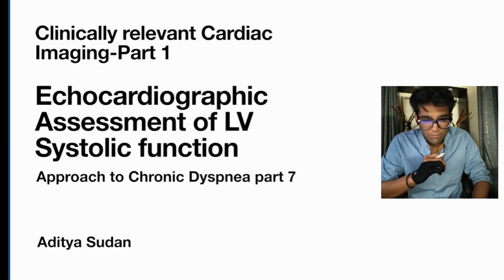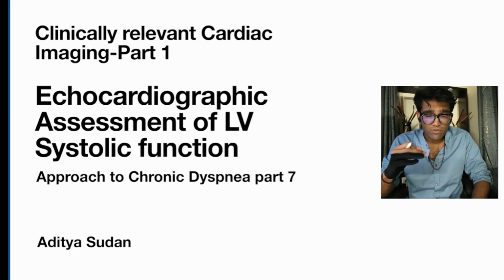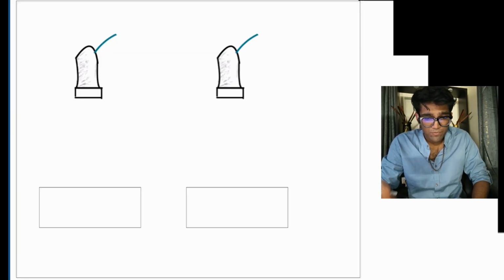So we'll begin with a review of the core concepts of the physics behind 2D echocardiography and image formation, although I'll be going into this in more detail in a separate series. Then we will derive the measurements that need to be taken in order to assess LV systolic function for this video. Okay, so let's start.